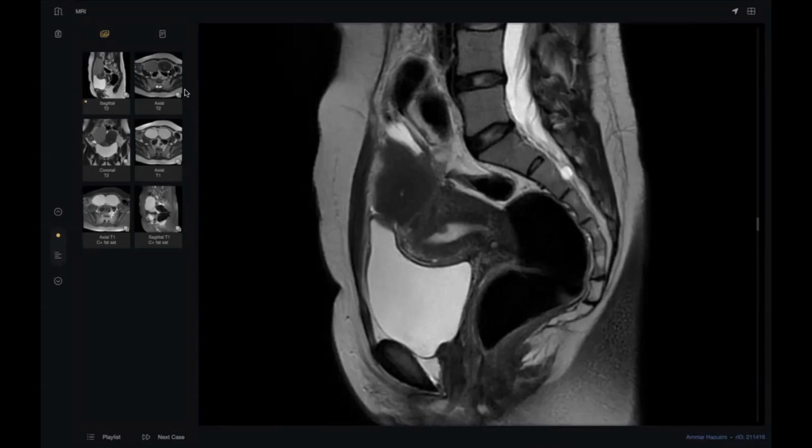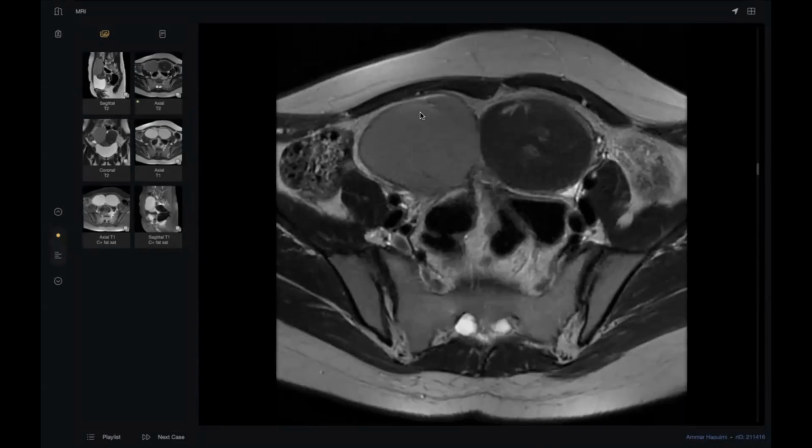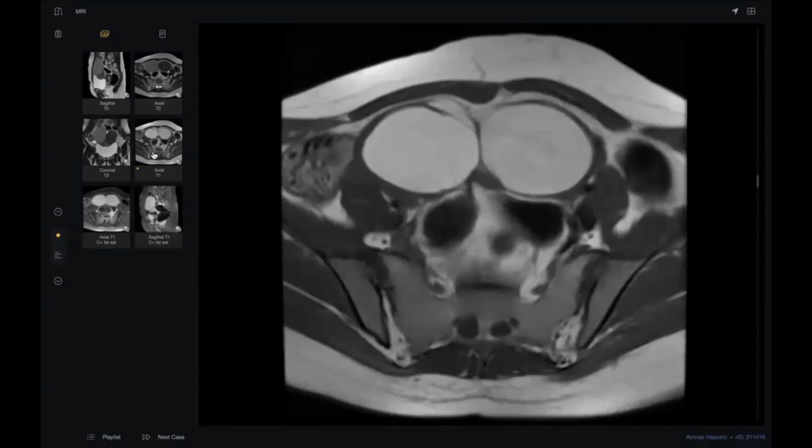See, doctor, when you see T2, you pick up this T2 shading sign. What is the shading sign? Different degrees of gray, gradual. Due to recurrent bleeding, here it is dark in T2. In T1, this is a high signal.